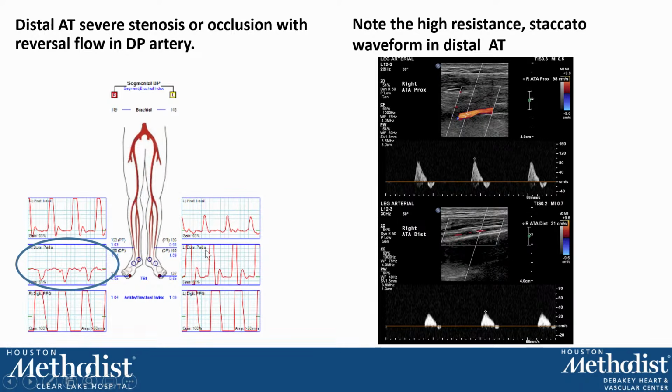Again, another patient: normal posterior tibial, normal anterior tibial, dorsalis pedis, some abnormality in the distal posterior tibial artery on the left, but there's reverse flow in the dorsalis pedis on the right side. And then what we see on the right side is the anterior tibial is open. The distal anterior tibial is very high resistance. It's also antegrade. So the area of stenosis here will be where? Between, almost at the ankle, just proximal to that dorsalis pedis vessel that you're trying to insonate. Okay?